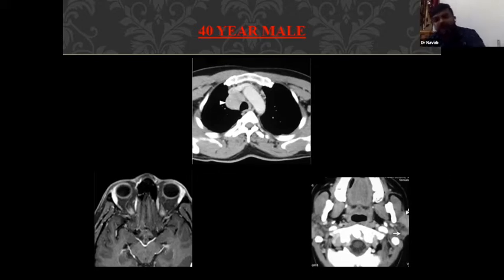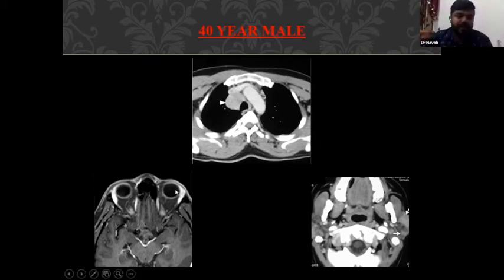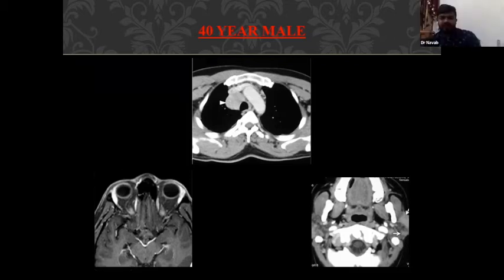You are seeing an enlarged parotid with focal lesions. Another image I am giving, an axial contrast section. Can you see the bilateral lacrimal gland enlargement? Yes, so this is one of the cases you already mentioned. This is a case of Sjogren syndrome. Sjogren's or sarcoidosis.